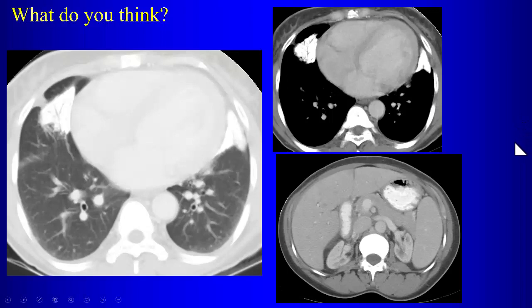Well, there's a clue. There's a last image there. What's the finding on the last image? Atrophic kidneys. Yeah, the kidneys are atrophic, right? So this patient has what? Yeah, end-stage renal disease. So how do you put that together with the finding in the lungs? What is this?